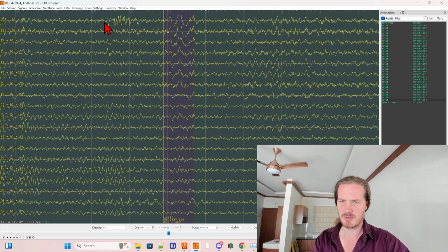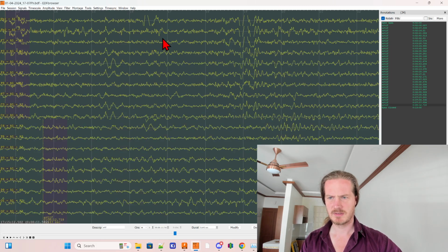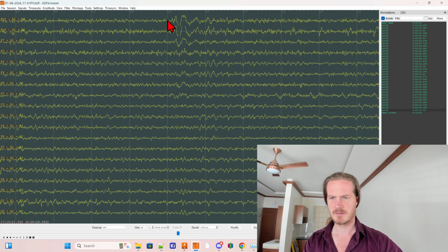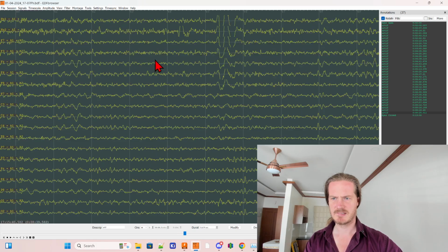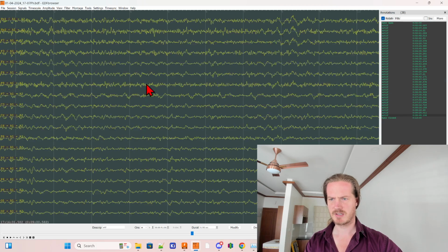Here we have a little bit of noise on only FP1, like a little frown or something. I'm going to remove it. Here's a small eye blink. And here's a bit of noise. Eye blink. Eye blink. So you can see our list here is growing.